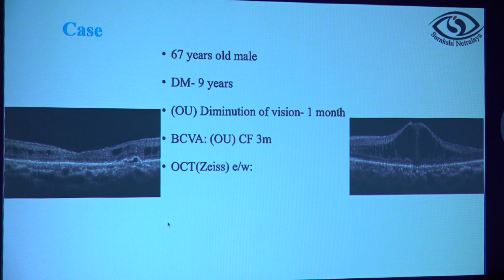Now this is a patient who came with this OCT, and in the left eye he was advised anti-VEGF injections.